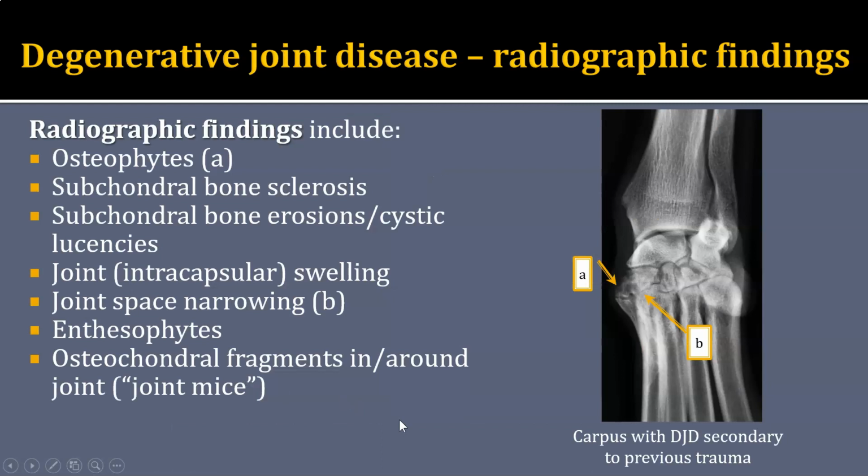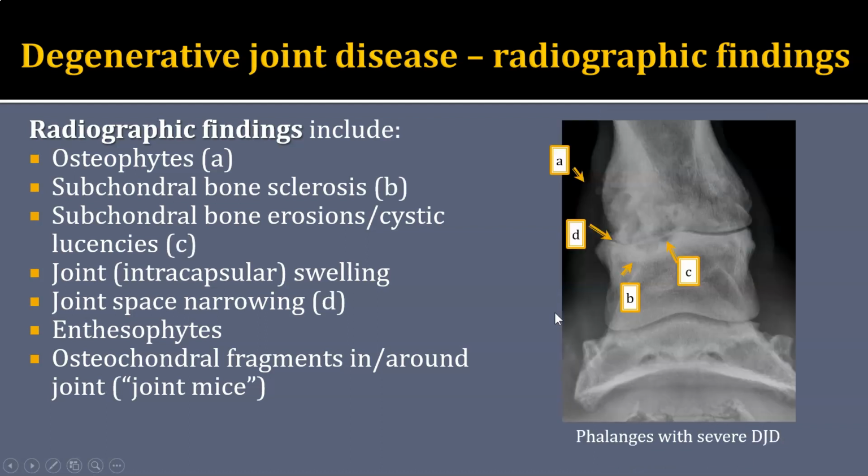This last patient was the tarsus. This is the carpus. This patient has very localized changes here to the medial aspect of the carpometacarpal joint, where there are fairly large but smoothly marginated osteophytes, which is that periarticular periosteal reaction at the level of this carpometacarpal joint. And then this is an example of some true joint space narrowing. We can compare that to the rest of the joint space that is a little bit wider and uniform all the way across. So this patient likely had trauma to this medial aspect of this carpus.